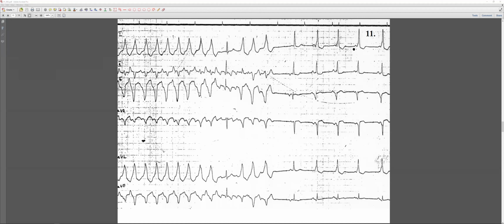So I guess this one looks to me like a WPW. Always start with the normal part, and this is the right side. If you see anything like this, you can say it is distributed into 2 or 3 parts. On the left we have a tachycardia, and on the right we have a normal one.